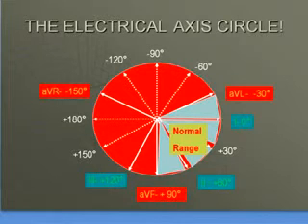Coming back to the previous slide, as a rule of thumb, you can also use a single lead to identify where the axis belongs. If the predominant R wave is in lead AVL, that is, the height of the R wave in AVL is more than in lead 1 and the other leads, then it is likely that the patient has a left axis deviation. If the predominant R wave is in lead 2, then compared to the other leads, the patient definitely has a normal range of QRS axis.